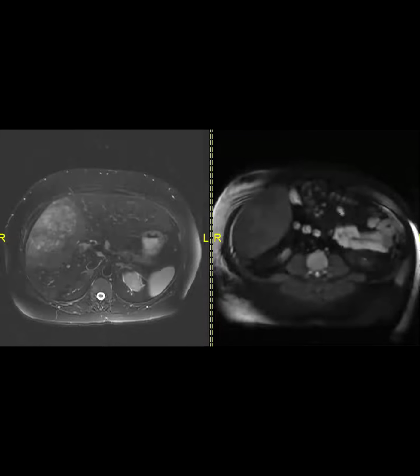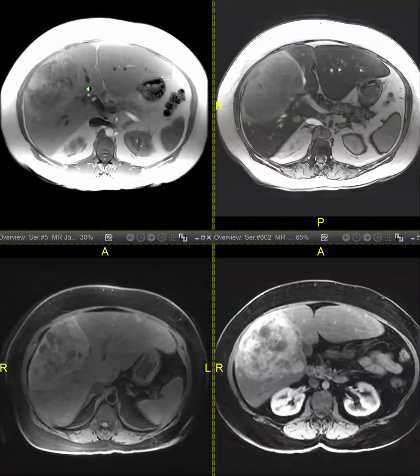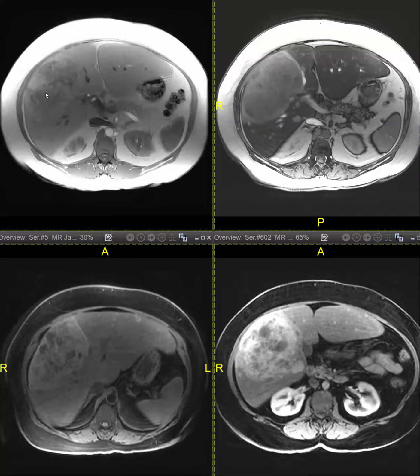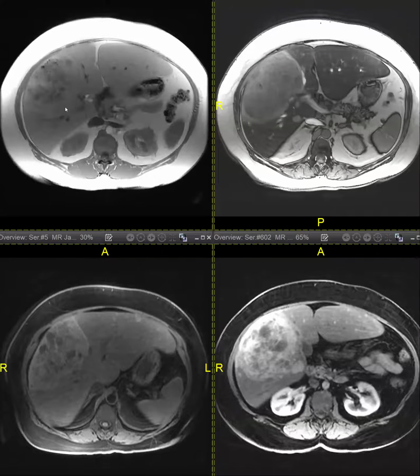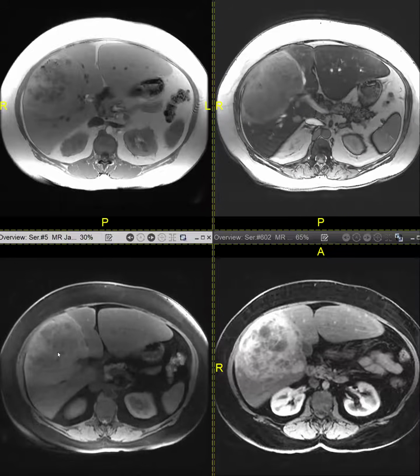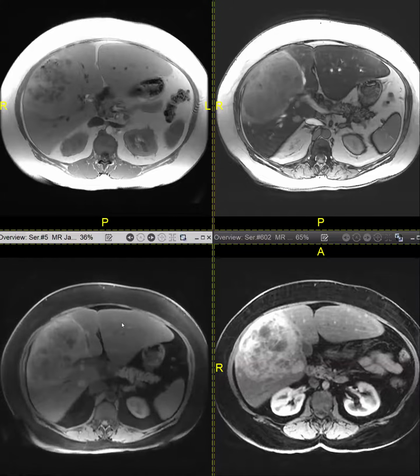So then you can see this is the pre-contrast, right? Because the liver is so fatty, you can see the T1 in phase, which is technically T1 without fat suppression. If you focus on the background of the lesion without cystic space, it is isointense to the background liver. But on T1 with fat suppression, now the lesion stands out as brighter. That's because the liver is so fatty, it actually drops on frequency-selective fat suppression.